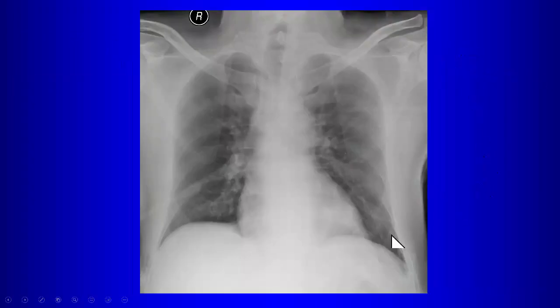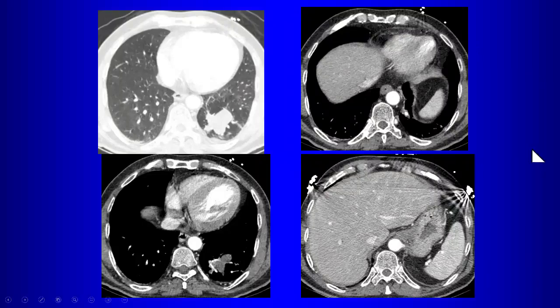All right, so this patient has a vague retrocardiac opacity, so we can see it here on the CT. Anybody want to say anything about this? Any characteristics that you notice? Low density where? So the lesion itself is low in attenuation. What about the surrounding lung? What do you make of that? That's also low. So what would account for that? Air trapping. What could this be?